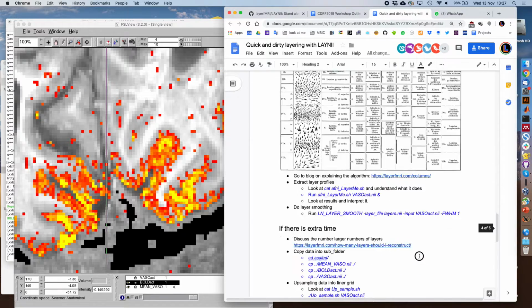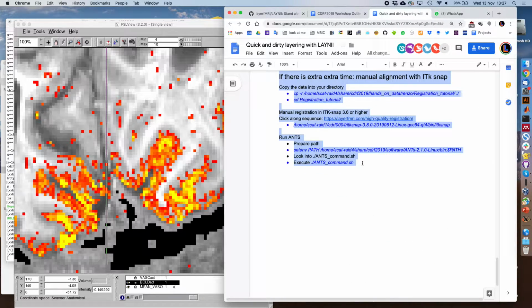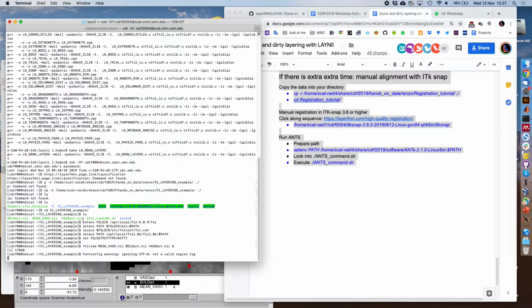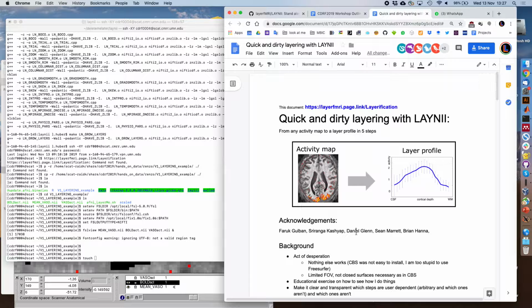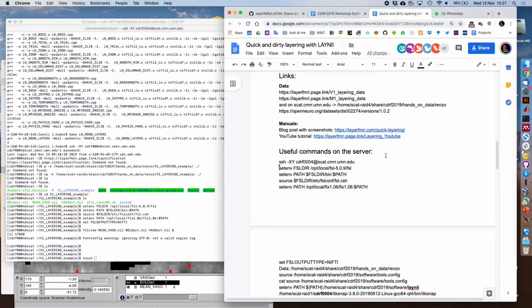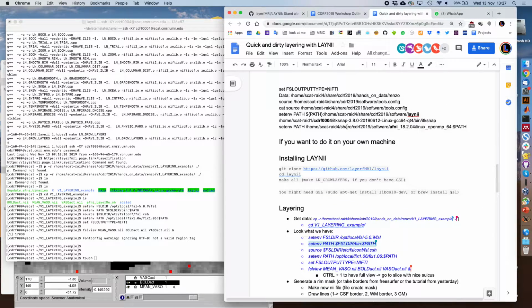These are all the commands. How do I do that? Maybe just create a cat into a text file. So where do you want it? In the same folder where we had the data, for example. The data are there.